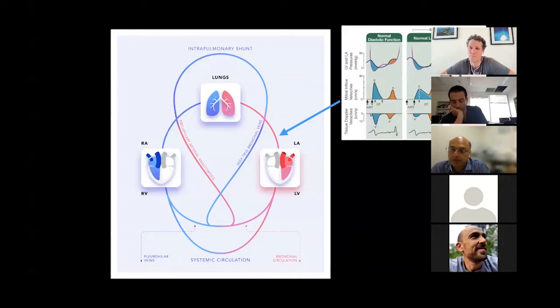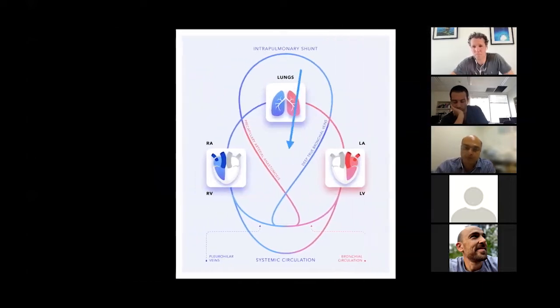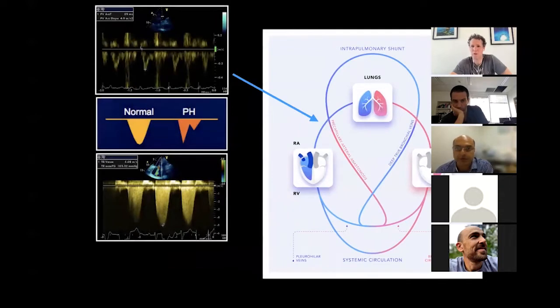And the same goes with the left atrial volumes in acute settings. Left atrial volume and area may not be elevated. Absolutely, excellent. I think it's also worth talking about how difficult it is to try and get all of these values sometimes in the critically ill. These are Doppler, these are all angle dependent, and imaging is sometimes tricky in the critically ill. Proper probe positioning and patient positioning, all those things. Yeah, nice work, nice work.